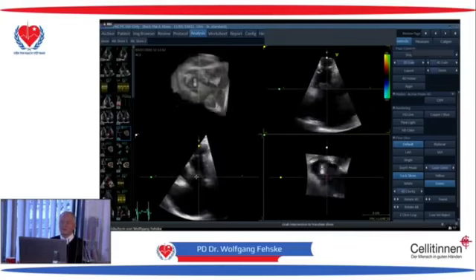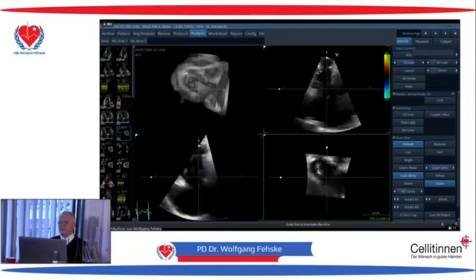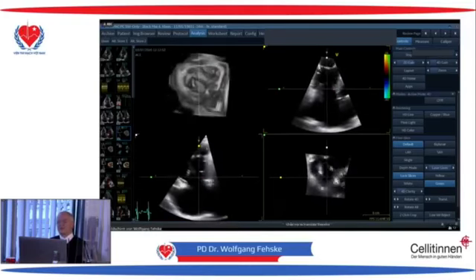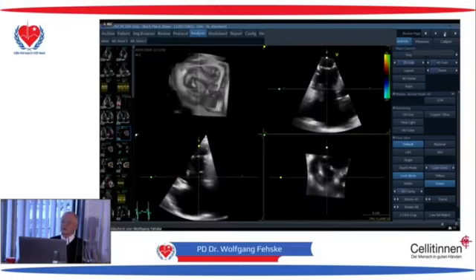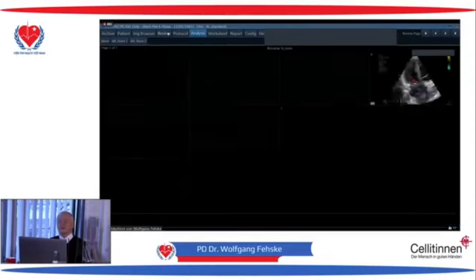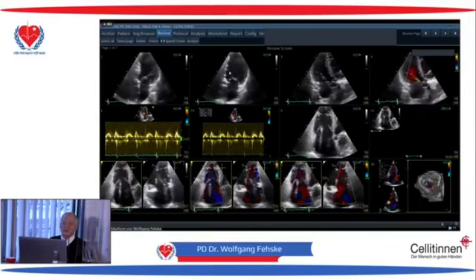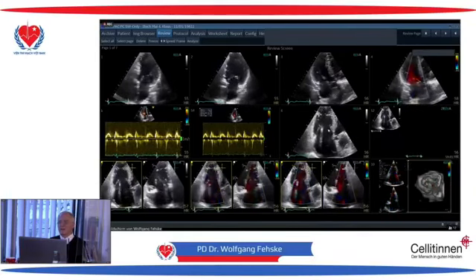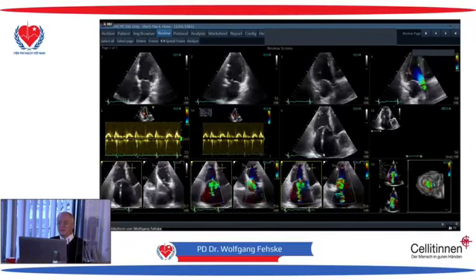And so we have the first situation that the annulus is not so large, that there is a pacemaker, and that there is a huge gap in the tricuspid valve. So we go further and look at what is the consequence of this tricuspid regurgitation and what is the true reason. We have seen that there is an RCA infarction, a scar. We have seen it's a large gap, and there's an akinetic lateral wall.